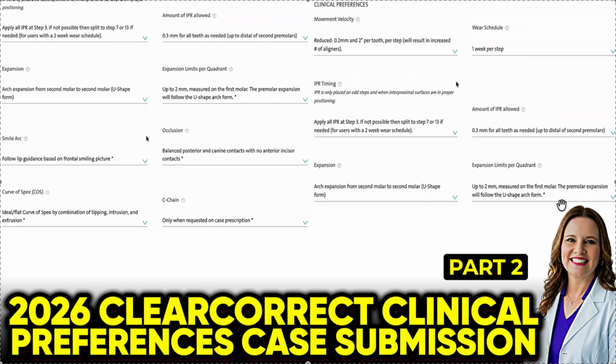In terms of the Bolton, oh shoot, the Bolton one is cut off. Okay, let me tell you about Bolton. That's really the last one that we didn't cover. So Bolton, there are a couple of defaults. I don't really care for any of the defaults. Usually the default I use for adults in Invisalign is to add IPR to the opposing arch. They don't have that as a default. And then for kids, I leave spaces on the top.